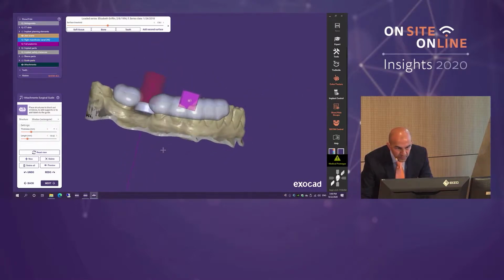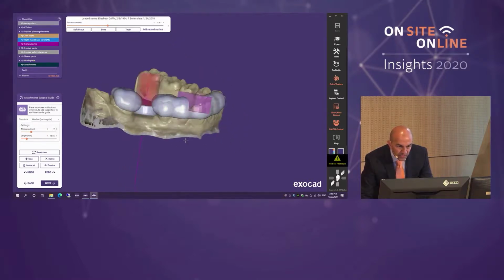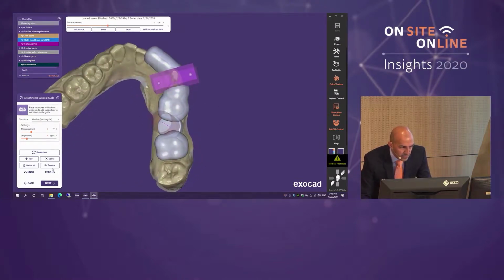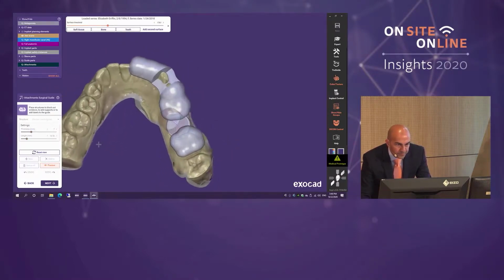We're keeping this one quite small, so I'm just going to go ahead and design it in a simple way. So like with the other elements of design, I'm using the control key to move and rotate the rectangular block around. If I hit this button here, preview, it will chop it out and it will show me, there's my window.